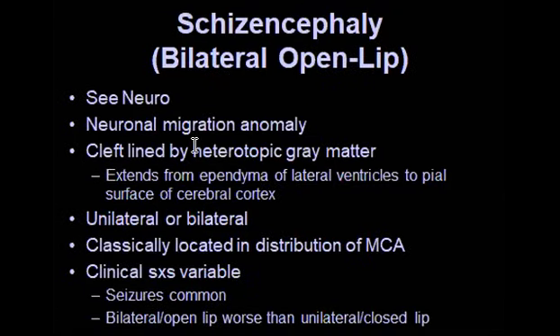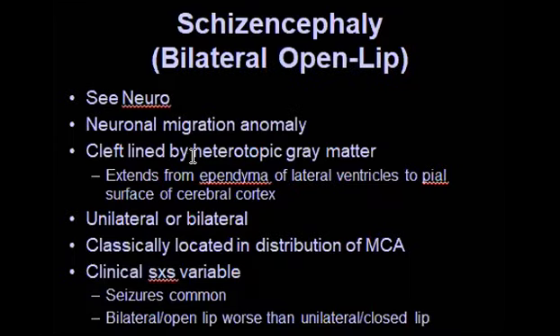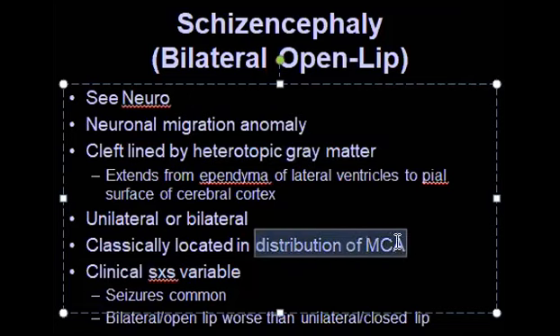The cleft is always lined by heterotopic gray matter, connected to the ventricle, so open lip. The classic location is the distribution of the middle cerebral artery.